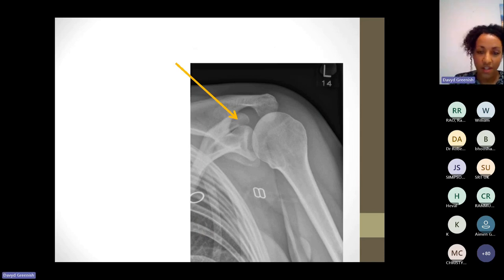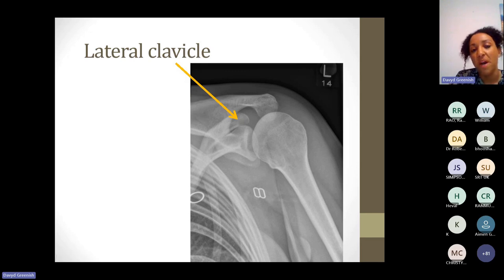And then this structure here, I've already kind of alluded to, so I'll just move quickly on. We know this is anterior because we've got the coracoid process, and we know that this bone here is the lateral clavicle and it's articulating with the acromion. So it's got to be clavicle and not coracoid process, because the acromion is here and it's articulating. So we've got the lateral clavicle there. Do be specific and right here. I think it's important to say that this is the lateral clavicle. If you were just saying clavicle, you might drop one mark if they're feeling particularly mean.